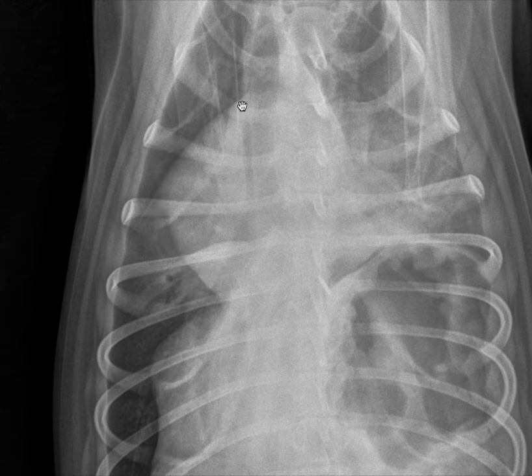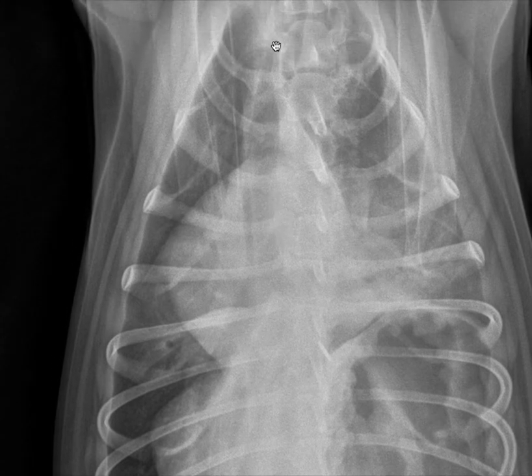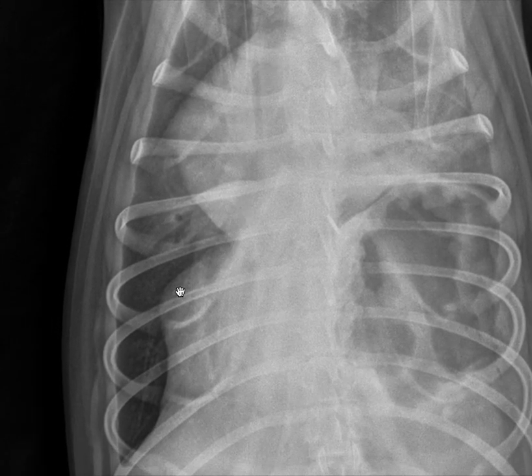Now, you might say, hey, the right heart looks somewhat generous in this case. We're going to come back to that because in my opinion, this is actually because the heart is being a little bit displaced. The second thing that I look at once I've looked at the heart is the lung. If we skim the right lung in this patient, you can see that generally speaking, we have appropriate opacity within the right cranial lung and also within the right caudal lung.